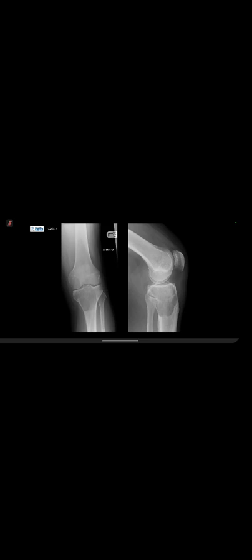So I think this is a really nice example. It's lucent. They don't tend to have sclerotic margins, so actually that's a nice discriminator. It's a lucent lesion with no sclerotic margin. They tend to predominantly occur in the skeletally mature. When we were talking about the previous case of the unicameral or simple bone cyst, that was a pediatric case with open physes. You don't tend to see GCTs in skeletally immature patients.